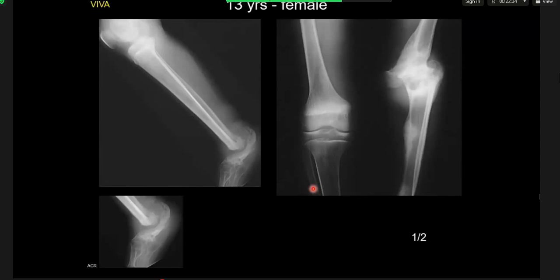So this is a radiograph of both knees, tibia and fibula and foot. There's complete deformity of the left knee joint, which has a bizarre appearance with increased sclerosis and expansion of the joint. There's also destruction of the talotibial joint on the left hand side.